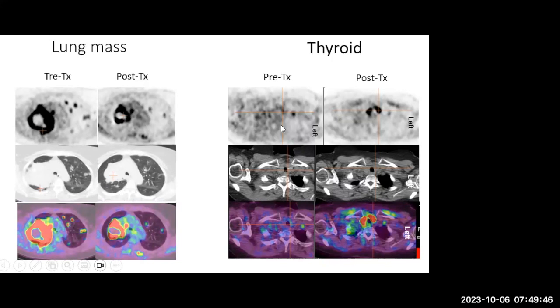One problem is that the thyroid was okay, no abnormal uptake. You can see the intensely avid activity on the follow-up scan. This is what is called destructive thyroiditis, which may be associated with these immunotherapy agents. So something to keep in mind, because these patients become profoundly hypothyroid and do need treatment with thyroid hormone supplements to be able to fix that, because the TSH is very high when this happens.